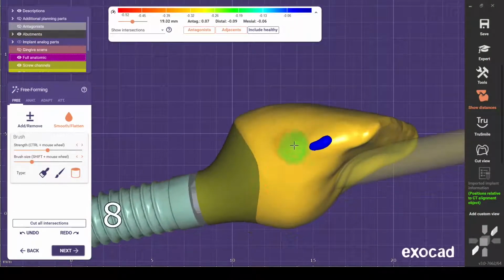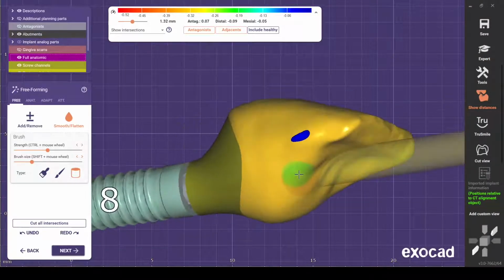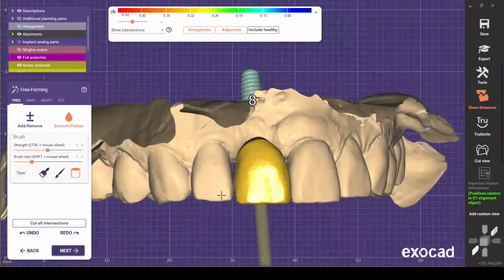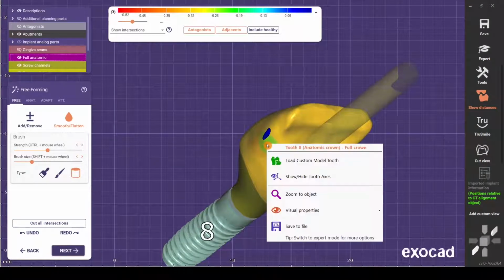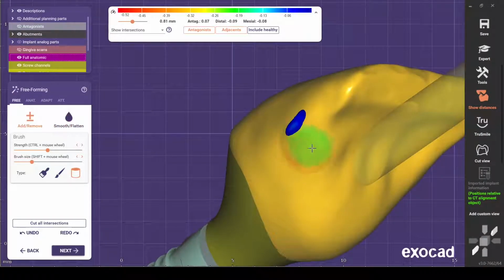So what that's telling me is that we haven't quite worked out the diagnostic planning on this case. We may need to do just a little bit of mesial composite veneer or addition to this lateral incisor here, so that can be symmetrical. All right, just add a little bit more from the lingual.